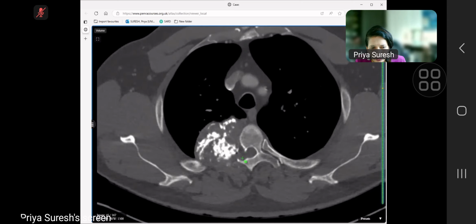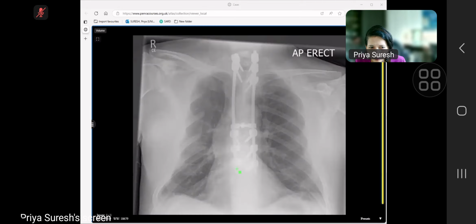Yes, the tumor extending into the spinal column. It was a chondroid tumor, but they had to intervene when it started invading into the spinal canal. I think I have a post-surgery image, because they had to remove it because it started going into the canal.